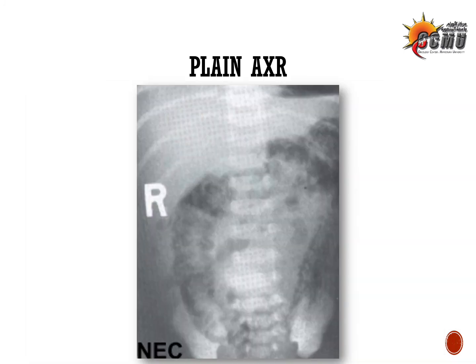Okay, sometimes you may encounter a plain X-ray of the abdomen in a child or an infant actually, and this is known from the small vertebrae and the very small ribs that the film shows. This film shows linear streaks of intramural gas, or gas within the bowel wall, not inside the lumen, and this denotes infarction of this bowel wall.